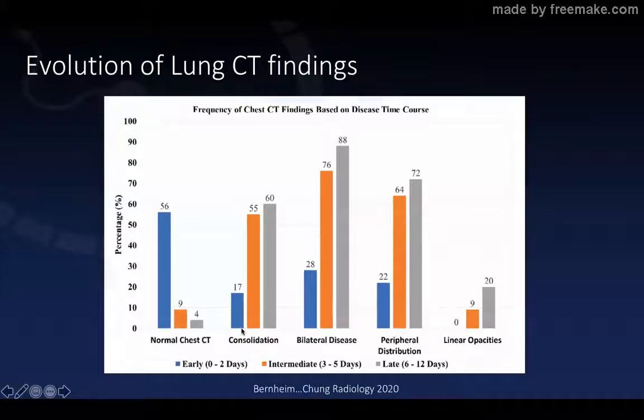And so as the disease progresses, one can see increasing consolidation, with a greater percentage of patients having consolidation in the lungs in later disease.